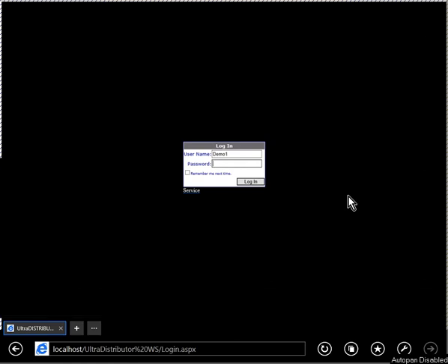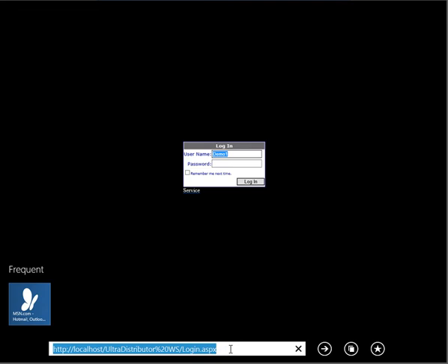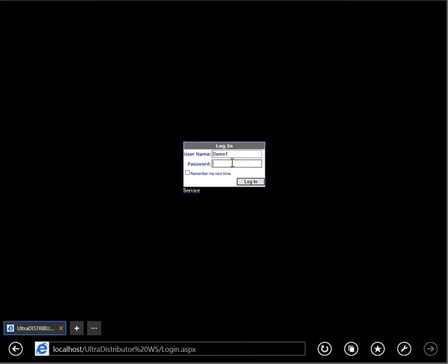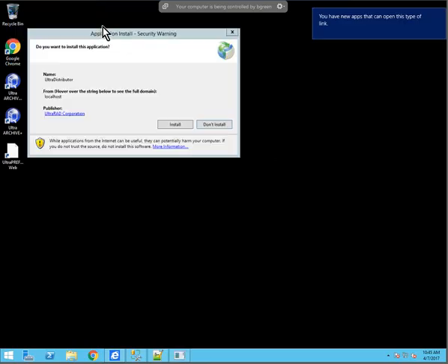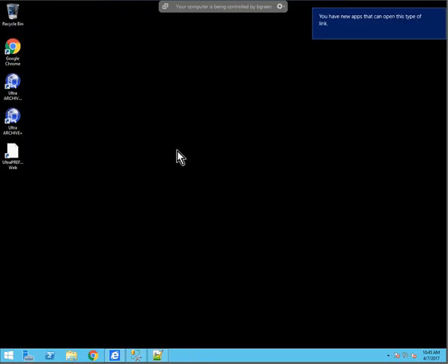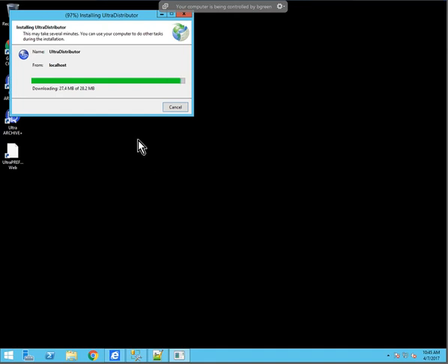To install the Ultra Distributor client, you're going to go to the URL for the Ultra Distributor server. So I'm just going to use the Demo 1 account. Demo 1 is the password. You click Login. It's going to prompt me to run the installer. I'm going to click Install. It'll download the install files.